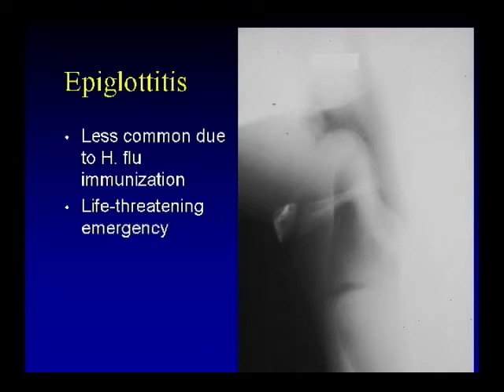Do you know what this is? It's epiglottitis. How many of you have actually seen a live case of epiglottitis? It's becoming much, much less common because of Haemophilus influenzae immunization. And I'm going to show you the last two cases we had.